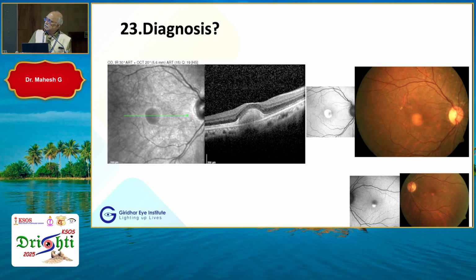This is actually, yesterday, I think, I have shown it somewhere else also. A large yellow area in the center, and there is no macular edema, in fact. Unlike a CNVM, there is no IRF or subretinal fluid, and fundus autofluorescence shows a hyper-autofluorescent area. This is a classic adult onset foveal vitelliform dystrophy. Vision will be very good, 6/9 or 6/12. So that is a clue.